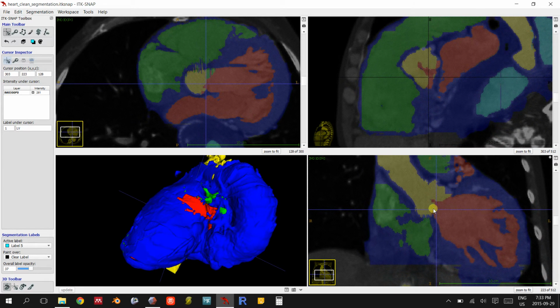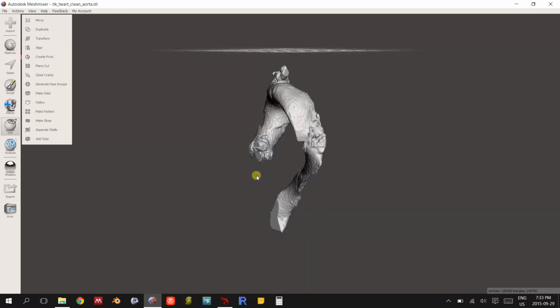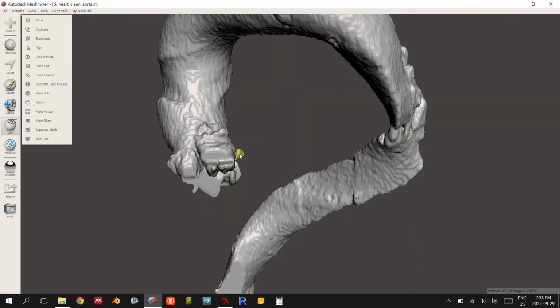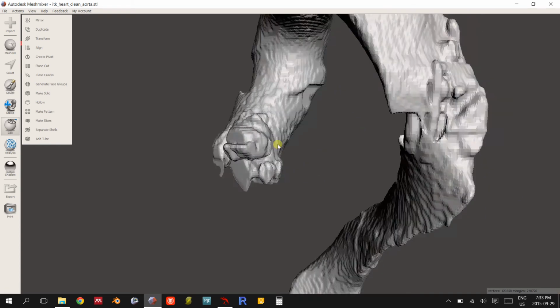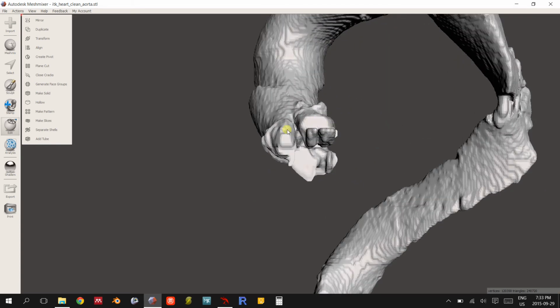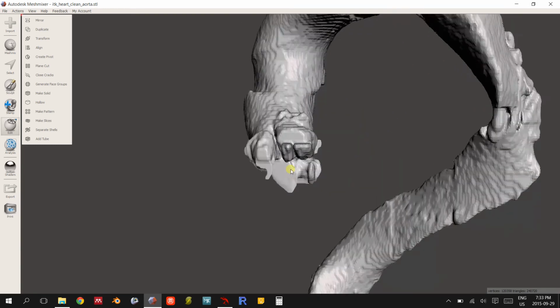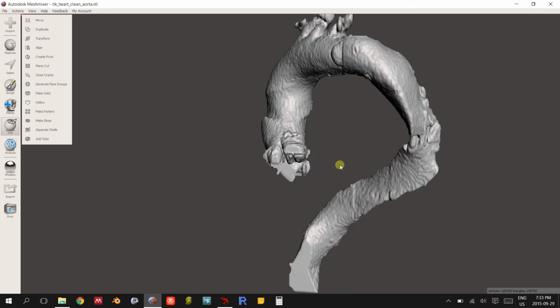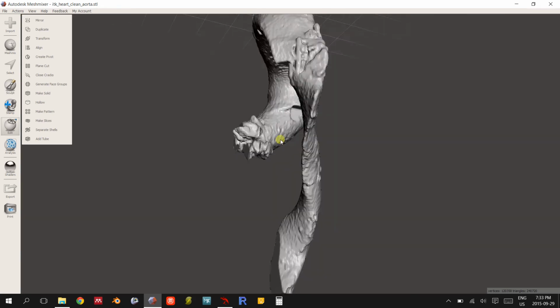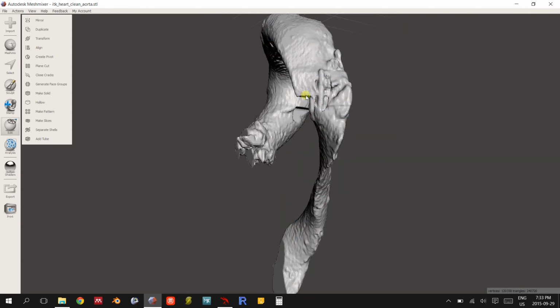And you can also see these two bumps. What those two bumps actually are, I think, would be the valve, or at least the outline of the valve. You can't really see it on MRI CT, but there are three very distinct bulges on the beginnings of the aortic arch, and I think those would be where the valves would sit. So it's in theory possible to print this heart with at least a slight outline of the aortic valves, or some facsimile of it.